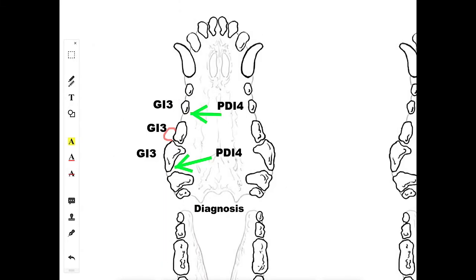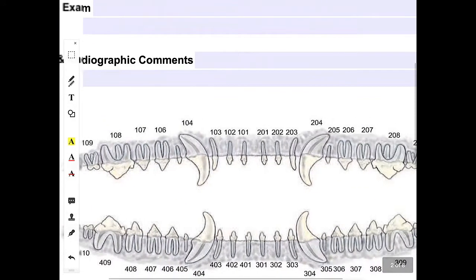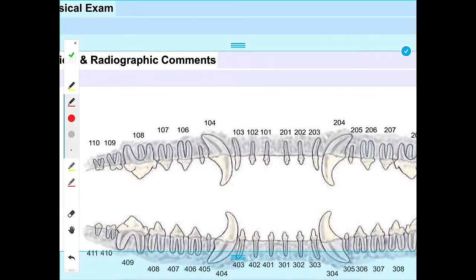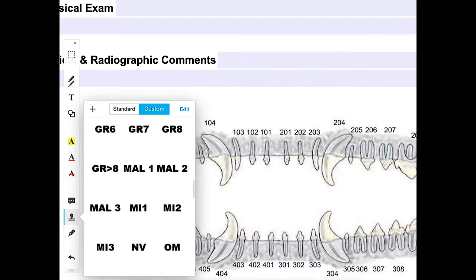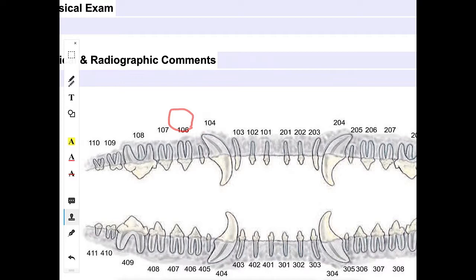And so we can go to the second screen where we have the arcade visible, and we can place that little cups lesion by doing the exact same thing. So we'll go up here, hit that, and then go up here and make that little lesion, and then hit your checkbox again at the upper left in the green. Go back to image stamp, and there's a cups image stamp here, so we'll just go to that, hit that, and there you go.